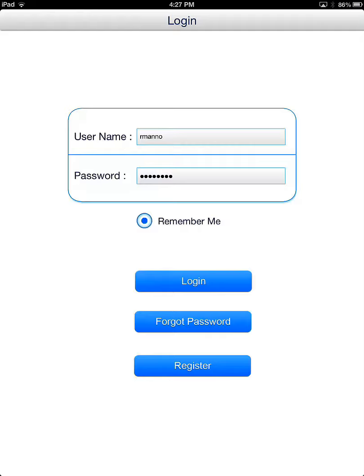A little background. This app was developed to assist the orthotist, certified orthotic fitter, and podorthist with the proper documentation and assessment. The app is ideal for compliance, audits, accreditation, risk management, quality assurance, and professional documentation.